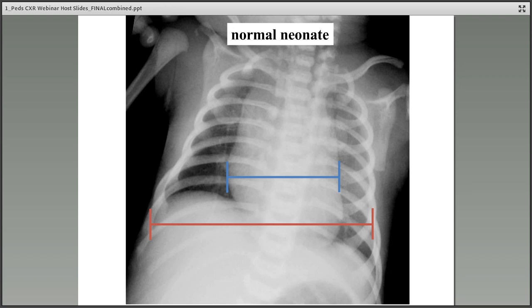In addition, the thymus is sizable, and along with small pulmonary vessels, the enlarged thymus and cardiac silhouette make evaluation of adenopathy and perihilar consolidation very difficult.